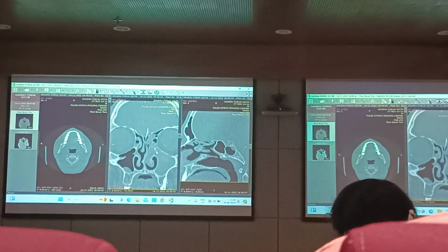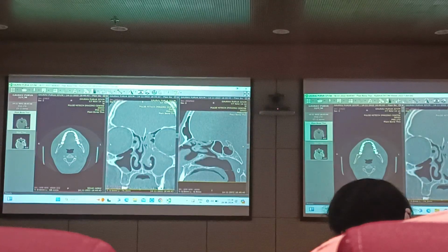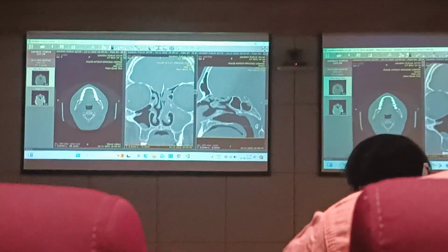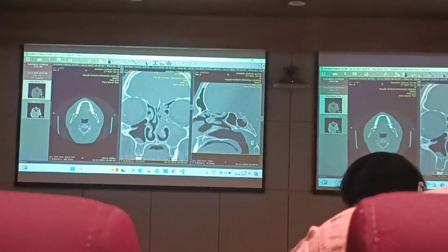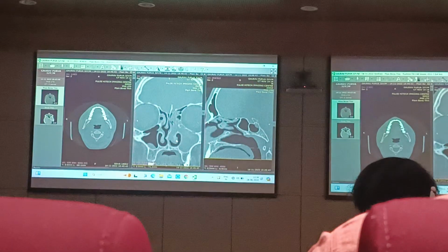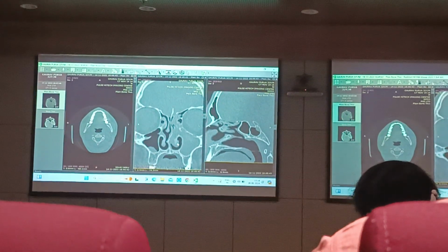Or this could be an inverted papilloma. When you do an endoscopy from here, even in inverted papilloma, you just see 2 or 3 polyps hanging over there because it pushes and prolapses the mucosa. So inverted papilloma, and biopsy never, unless you see a fleshy mass inside. Never, never biopsy without having an MRI.